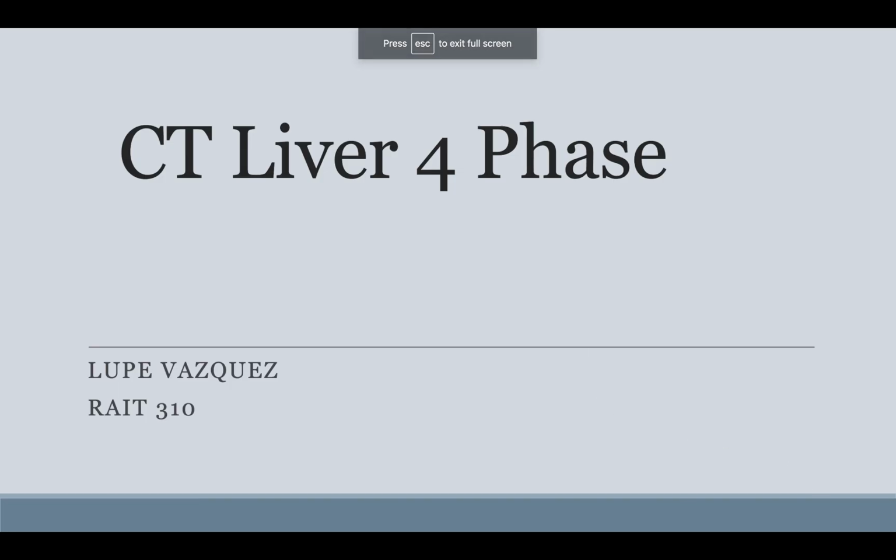Hello class, my name is Lupe Vazquez and today I'm going to be talking about a CT liver 4-phase and what is included in this exam, why we do these 4 different phases, and we'll also be looking at a case study in which the physician ordered this exam for a patient.